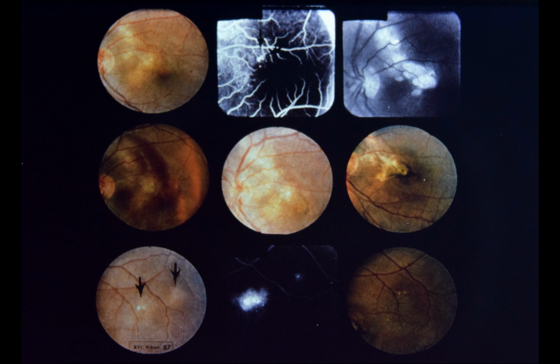One month later, center left, note progression of choroidal infiltrate in macula. Two months later, directly center, note beginning resolution of choroidal infiltrate. Fifteen months later, center right, note complete resolution of choroidal infiltrate with macular scarring. Visual acuity was still 20/50.